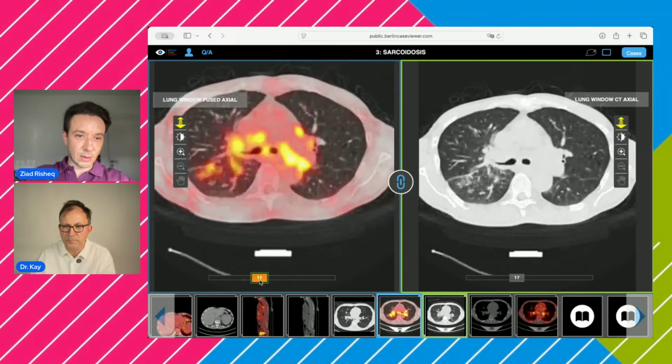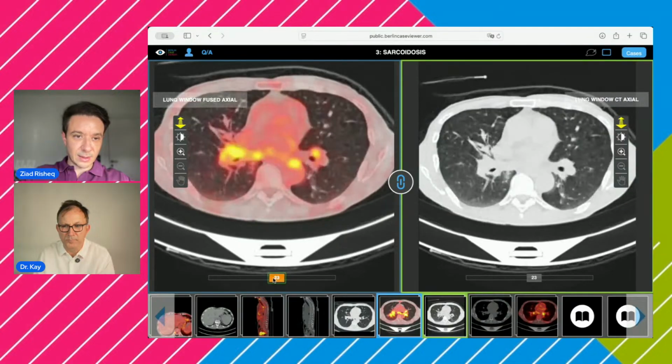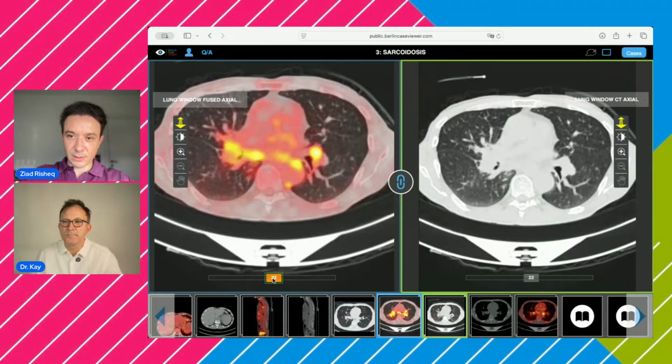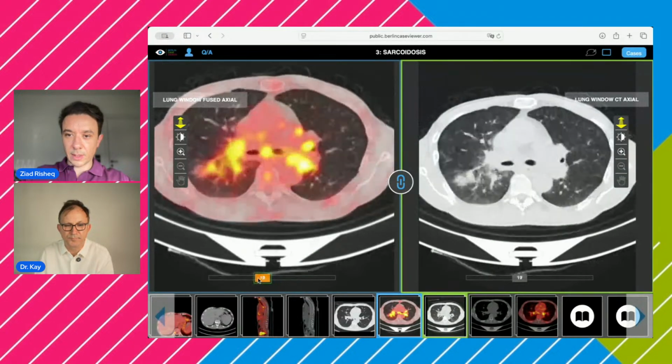And when we go down, basically this is why the patient was referred. You can see this central or peribronchovascular consolidation. There's a bit of ground glass surrounding it. It looks like it has irregular margins, and it is showing intense uptake. So here you can see the intense uptake. You can see how this is extending. So this is peribronchovascular consolidation with surrounding ground glass, and there is a bit of narrowing in the lumen of the. Let me go back.